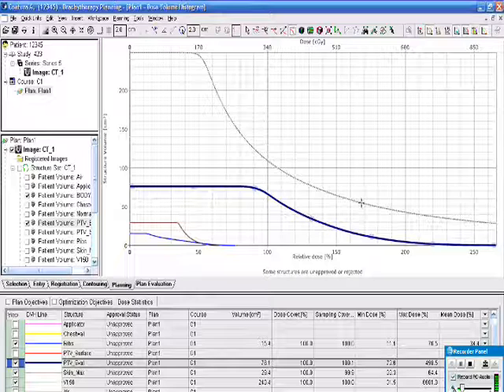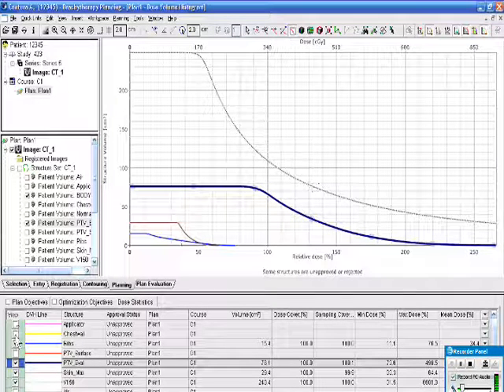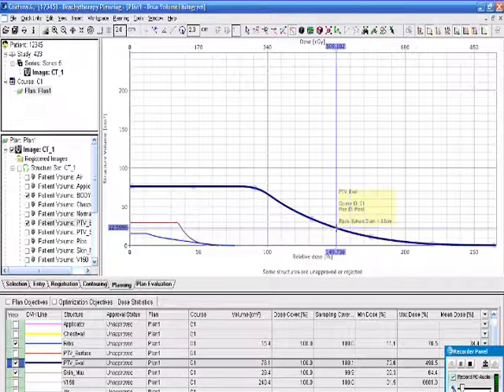This is at V150. But I know in this case that it's not relevant because they should be identical. So I'm going to turn that off for right now. I did that on purpose just to show you that issue. But let's look at what the V150 is here.